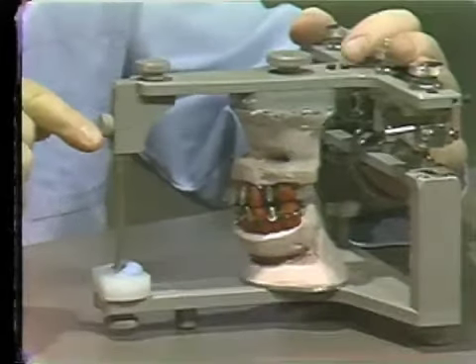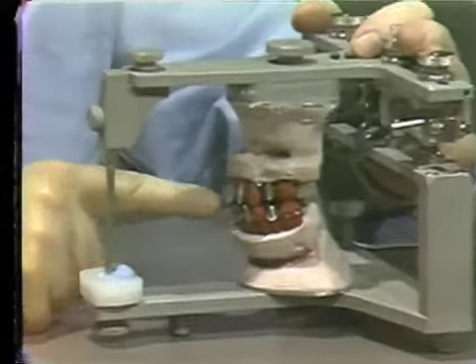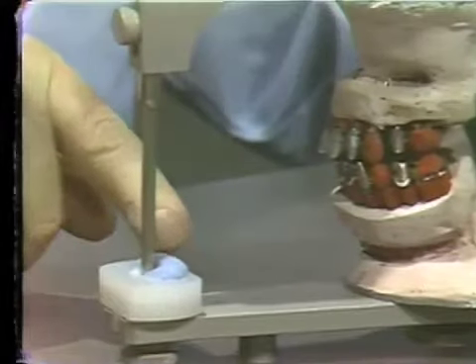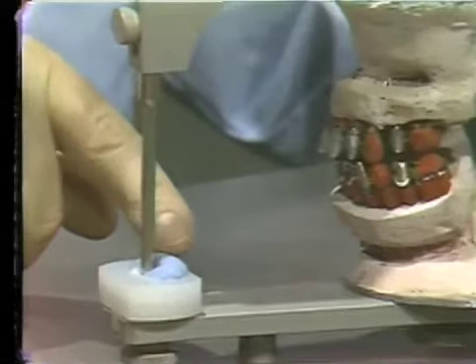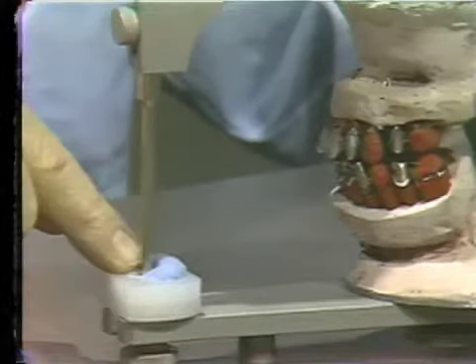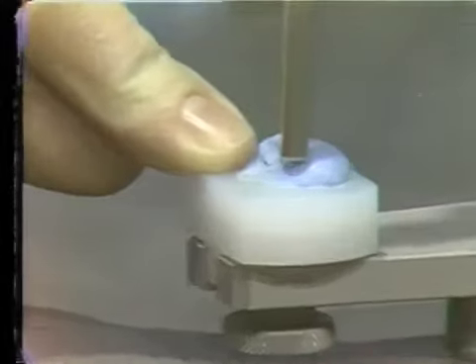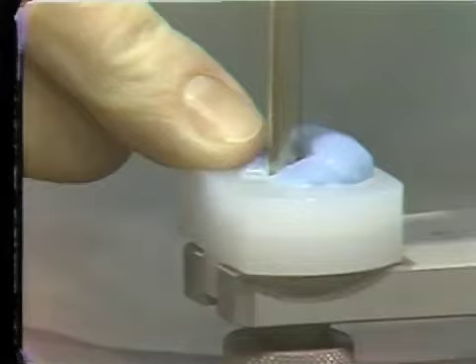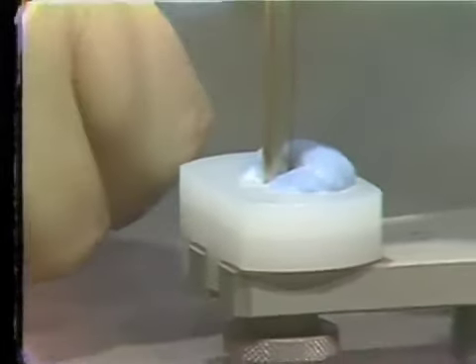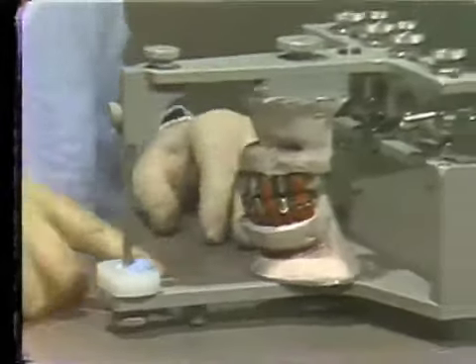We've also destroyed any of the anterior guidance for the case. This must be set tentatively when we send it to the laboratory. So from the study cast mounted on the articulator, we have made a custom incisal guide table which gives us the guidance that we would want to start in the restoration of this case. This would be a tentative guidance to transfer over to the lingual surfaces of our anterior teeth in the wax-up.